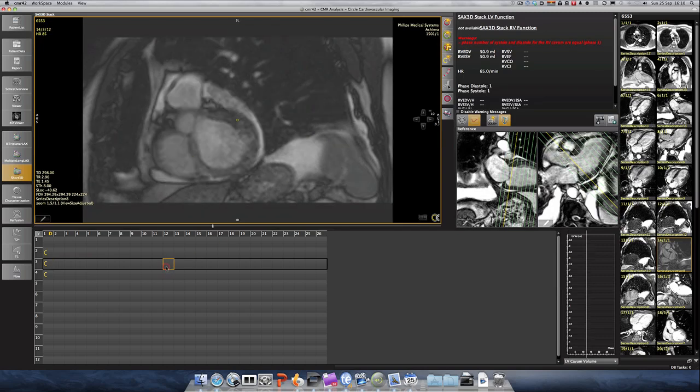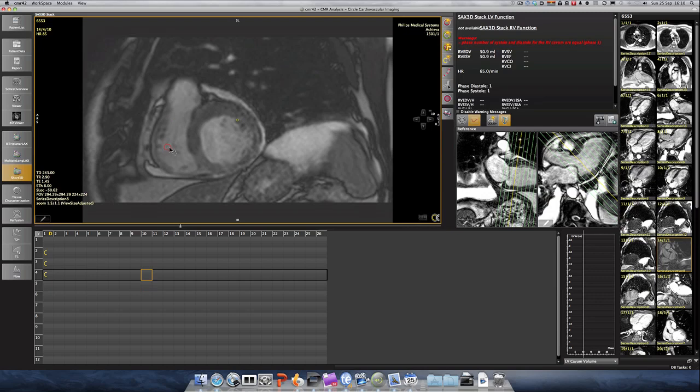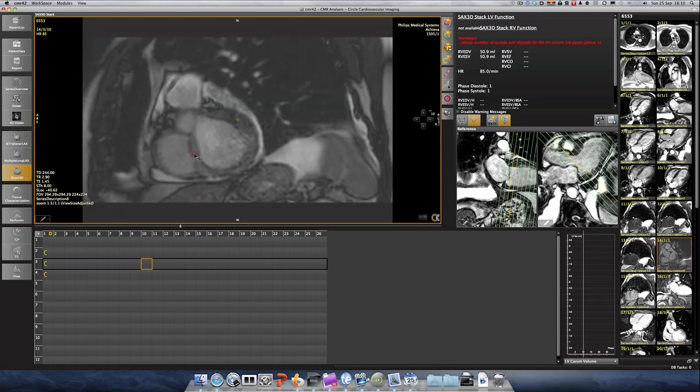So in systole, if you identify your systole based on the LV smallest cavity, let's say here, that's all RV. We go up, that's all RV. Now you get this clove-like looking part, so the RV, the pulmonary valve is going to come into plane, but I would include at least up to here. One further up you can see change. That looks like it's the pulmonary valve, so I wouldn't include this. And this very likely is the right atrium.